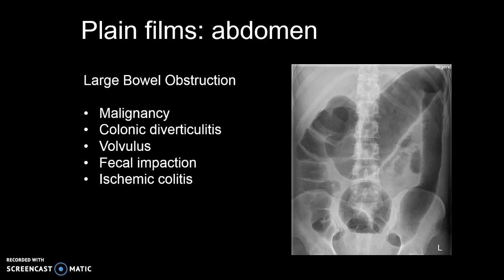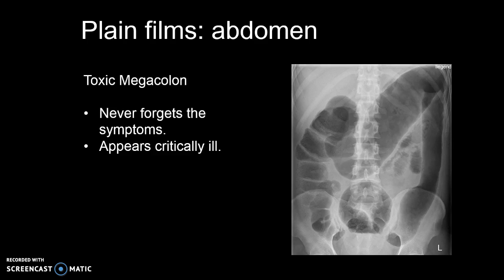Large bowel obstructions can occur because of many different causes. When diagnosing, use the symptoms as your guide. This patient presented to the ER appearing very septic and with x-rays was diagnosed with toxic megacolon.